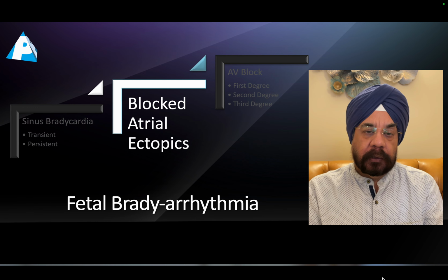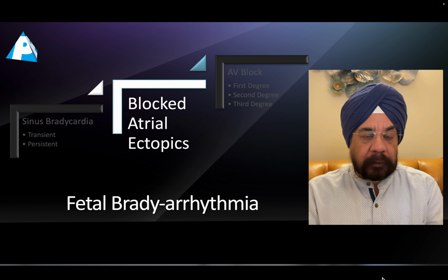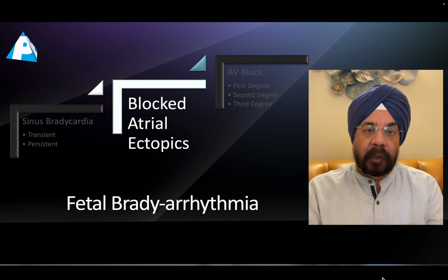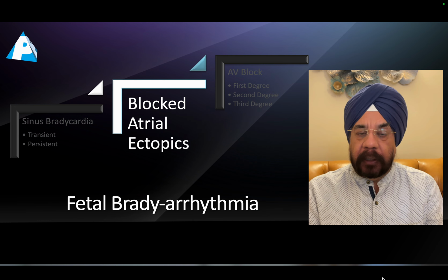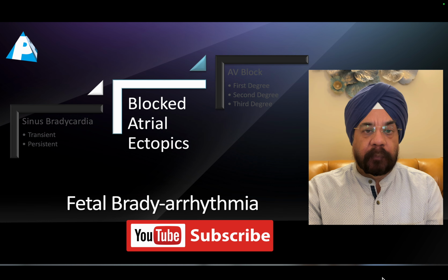Today we will discuss fetal echocardiography and fetal atrial arrhythmia. That's the commonest arrhythmia we have, but I've categorized it under fetal bradyarrhythmia because sometimes ectopics can produce bradyarrhythmia rather than causing tachyarrhythmia. Really? Can it do that? Yes. There is something called blocked atrial ectopics. So let's dive in and see what these blocked atrial ectopics are.